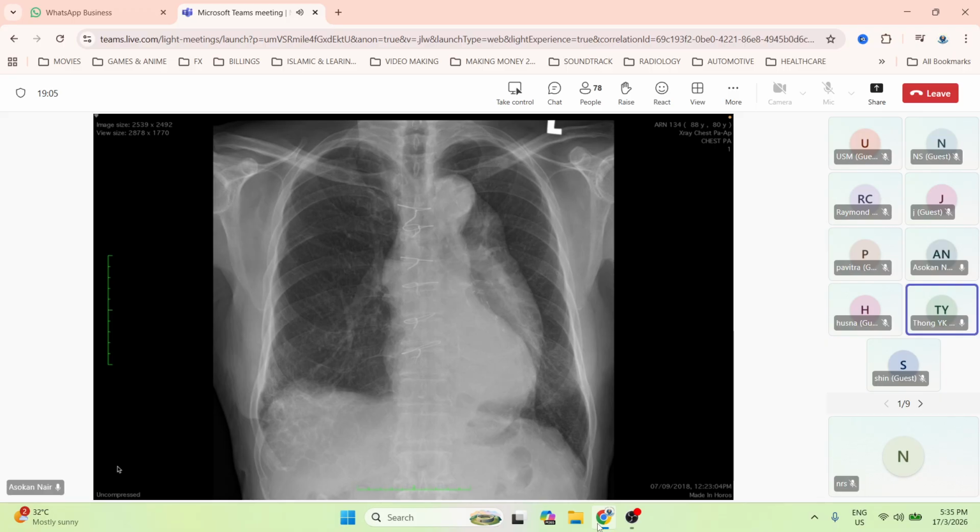There is a lobulated opacity seen at the area of the, I think this is at the area of the posterior mediastinum, as I'm able to visualize the hilar vessels. There is no obscuration of the left heart border, and there is obscuration of the left paraspinal line. There are also several linear opacities at this area in keeping with surgical clips.